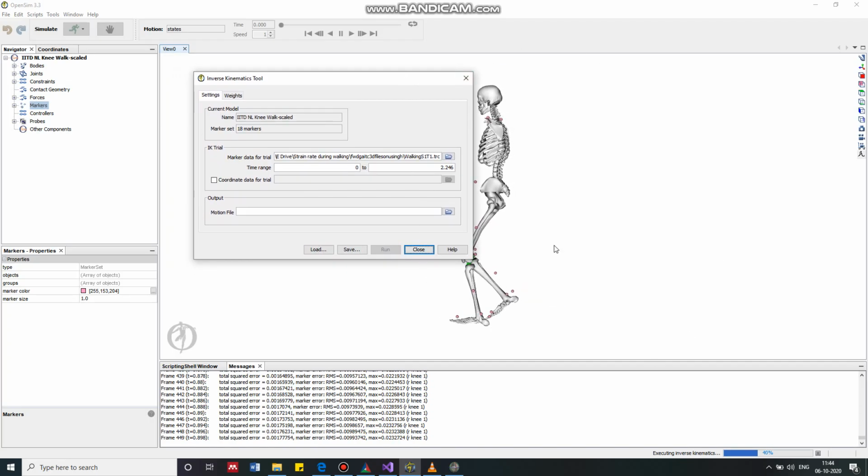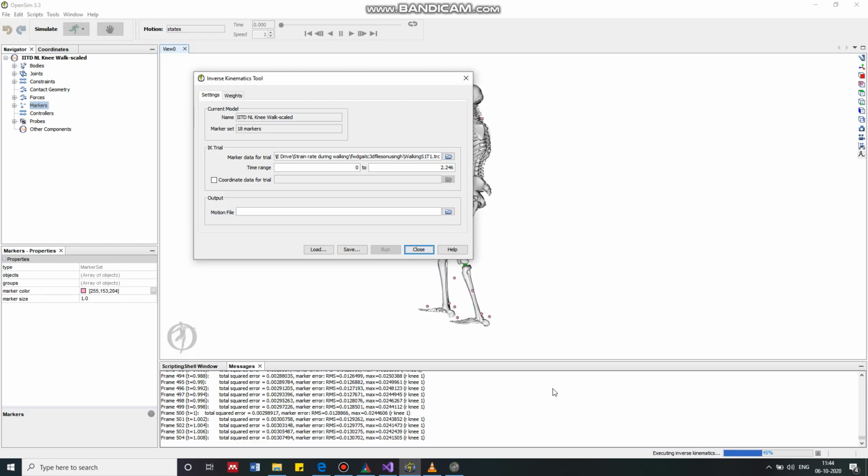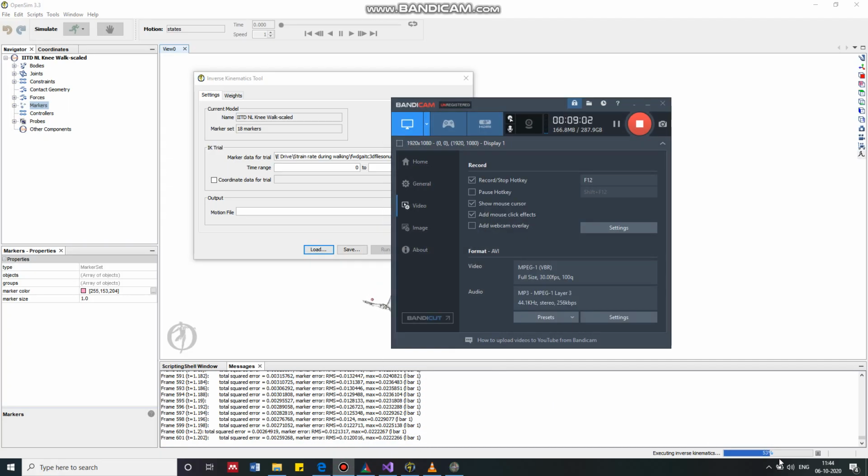So the data that we collected will have some crosstalk in it, high frequency crosstalk that can be filtered in later stages of the analysis. So let me pause the video right now because it's going to take some time.